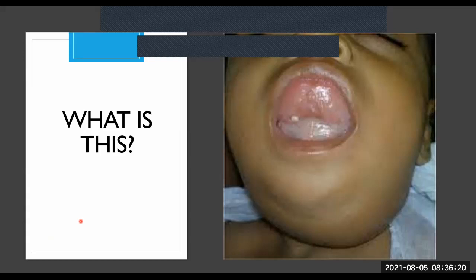Okay, so first, where's your epiglottis? Your epiglottis is here. Where's the problem? Here. So it's not your epiglottis, so it's not epiglottitis. Where are your parotids? Parotids. You said mumps. Yeah, parotids. Like, geez, man, what anatomy did you do? Look at the patient. Right. So where's the problem? Is it here on the side or is it at the front? It's towards the front and underneath.